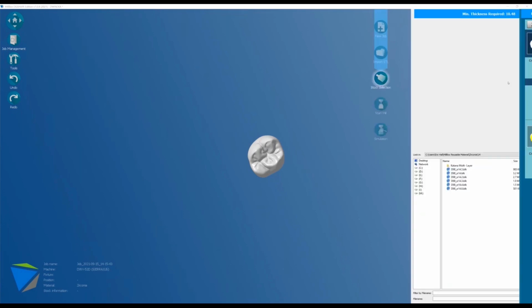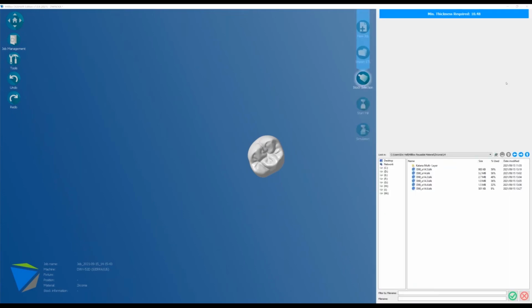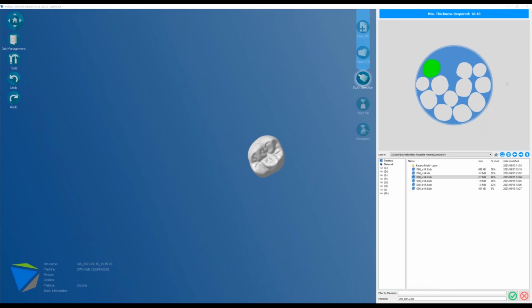So let me take a peek. All I did was click on that blue number. Now it automatically pulls this puck up for me. So all I have to do now is match the puck up. So what's it doing? It's going through all my 14s that I've already used. It memorizes these and remembers them for you. And it stacks them most used to least used.